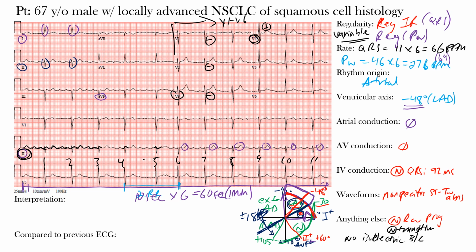We're likely dealing with a rhythm with atrial origin because of the multiple P waves that we saw, which have what we call a sawtooth appearance with an undulating appearance, and a regular P to P interval. In addition, it's less likely to be a junctional rhythm with this ventricular rate. Remember, junctional rhythms have a rate often between 40 and 60 beats per minute. Our ventricular rate here is above that, 69 beats per minute, almost 70. So that's a little fast for a junctional rhythm.